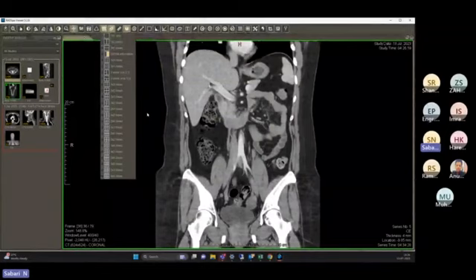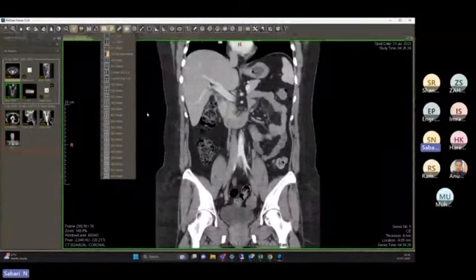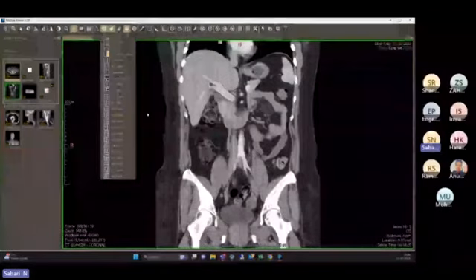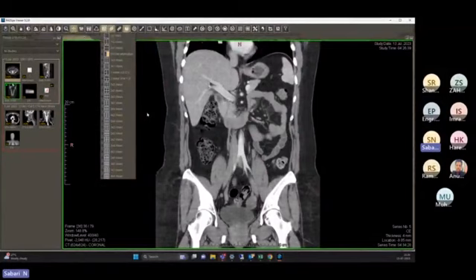Then you can print directly from the viewer, because in the modalities, the CT machine or MRI, X-ray and ultrasound, whatever the modality, it has the capacity of storing the images only for a limited time, like 1 week, 5 days, or 10 days, or maximum 1 month. More than that, you cannot store even a single study, because it will automatically delete the older study. That is the way AGFA or GE or Philips or any manufacturer will configure it.